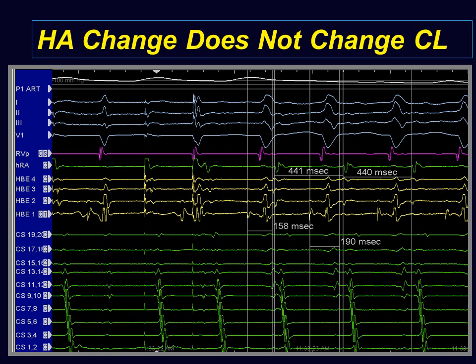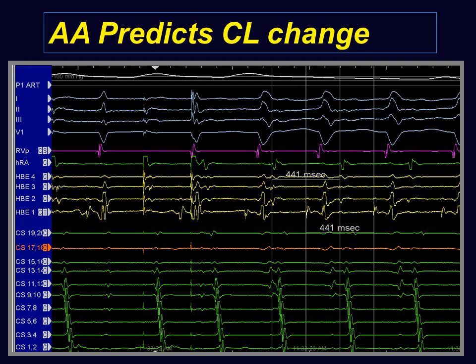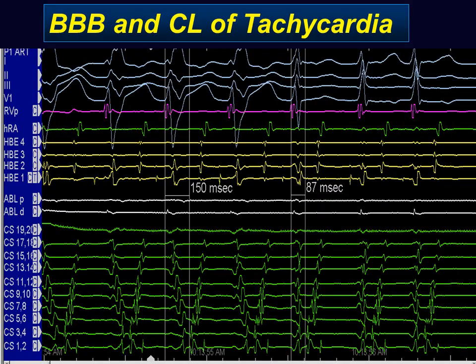If you have such during the wobble, the one electrogram, the atrial electrogram, is rather fixed, but the HA and the AH are fluctuating. That kind of favors atrial tachycardia. Of course, the A to A is the one that is driving the tachycardia, which is very suggestive of atrial tachycardia.